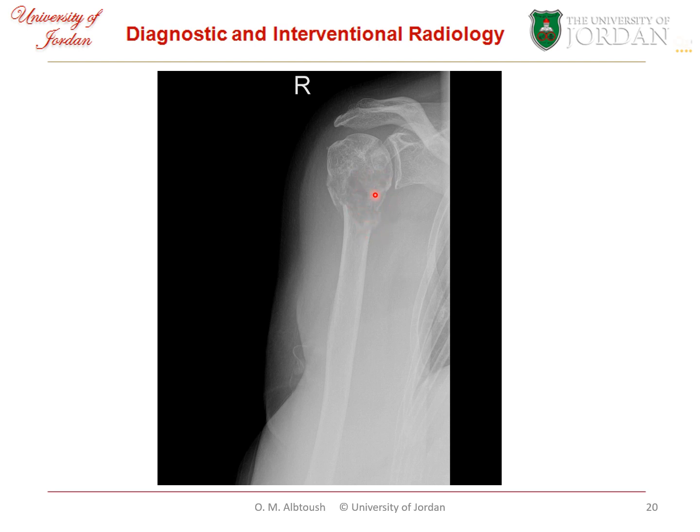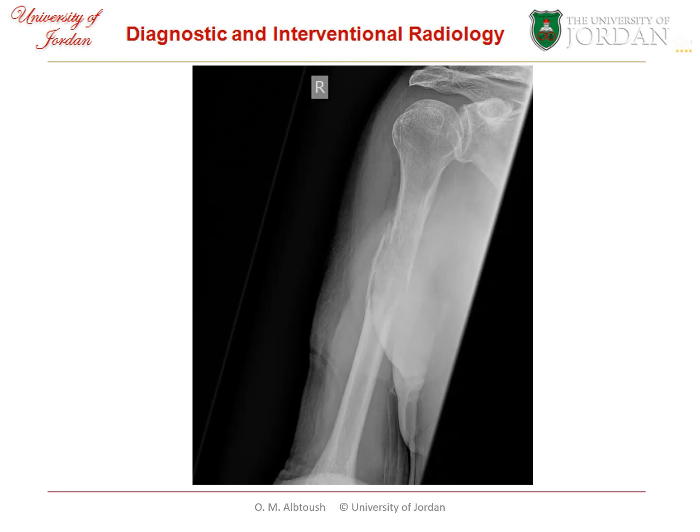Another example here, it's more or less clear that we have a destructive process at the right humeral head, and also a cortical defect, so we need to describe it as pathological. Another example here, we have a cortical defect, and here as well. It's clearly a fracture, but we also have expansion and a relative decrease in the osseous or intramedullary density, so I'm suspecting an underlying process.